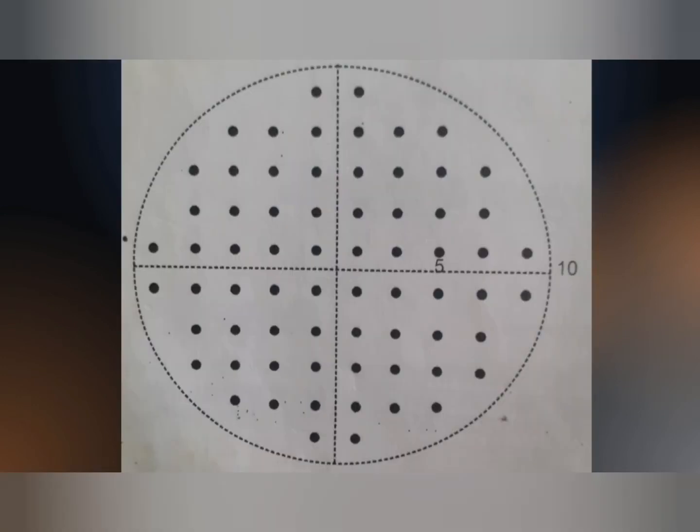Okay. This is the 10-2. So we have 30-2 and 24-2. What is the importance of this 10-2? 10-2 actually measures the central area more accurately, because earlier I told you that in 30-2 and 24-2, the central 3 degree area is not measured. So in 10-2, there are a total of 68 points, and the point difference is 2 degrees and the blind area is 1 degree.